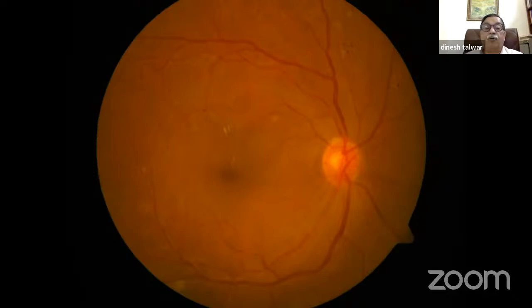Is it safe to do focal laser for this area? It will still be lying within the center. What is the limit given in the ETDRS regarding the safe limit for initial focal macular laser?